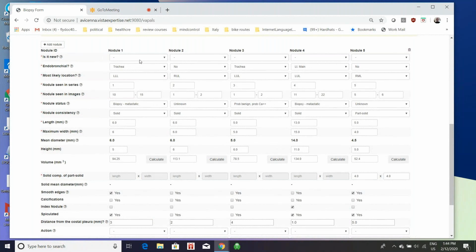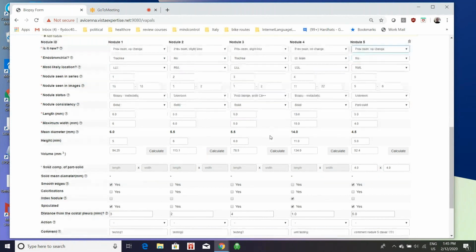They no longer have this first field done, because you know, this one maybe didn't have a change, this one maybe had a slight decrease. Let's say this went to 5, you know, this one maybe had a slight increase, maybe this went to 6. And by the way, after this happens, they don't resort, they only sort the first time by largest to smallest non-calcified. Later, if one of them outgrows another one, it still stays in the same location. And then you can say no change here.